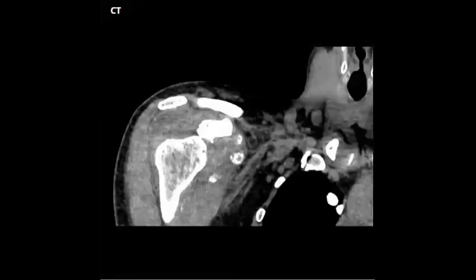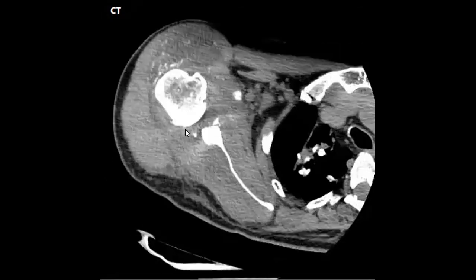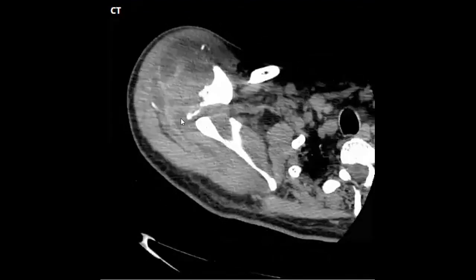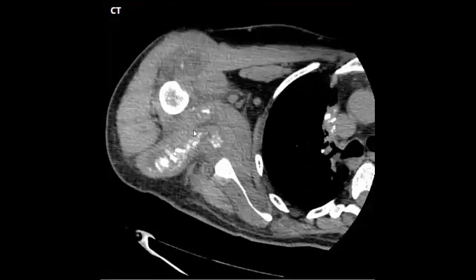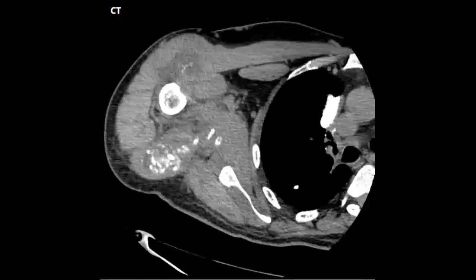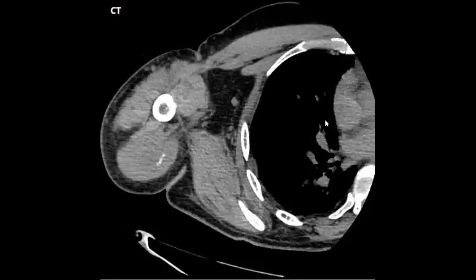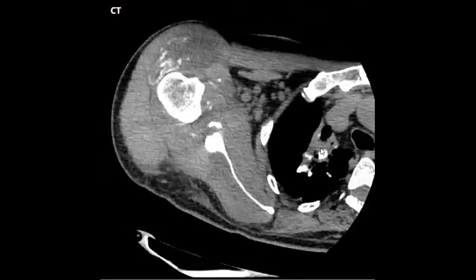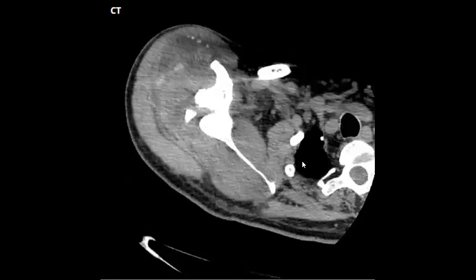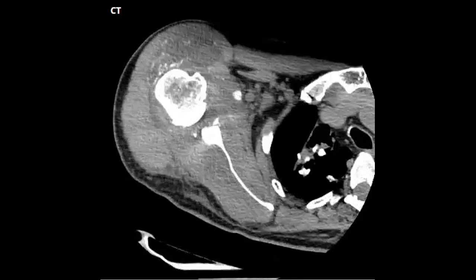If you go to the CT of the same patient, maybe you'll find the destruction more easily. I think you'll need to check the bone window for the destruction, but from this soft tissue window you can see it. And there is also something going on in the lung. There are some calcific densities, and it looks like there is probably granulomatous change here.